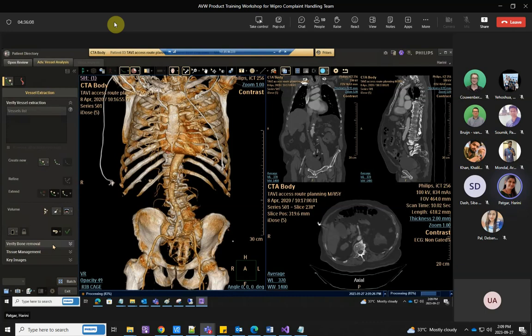This is time consuming. AVA itself is actually a huge application. And to load any configuration, we generally load AVA first, so that the memory is consumed fully. And if we want any defects, we try to load AVA first. Okay, it's 83. Maybe we can go to verify bone. I just don't want any tools to gray out. So I was just waiting for the processing to complete, because some tools will be available only after the processing is completed.